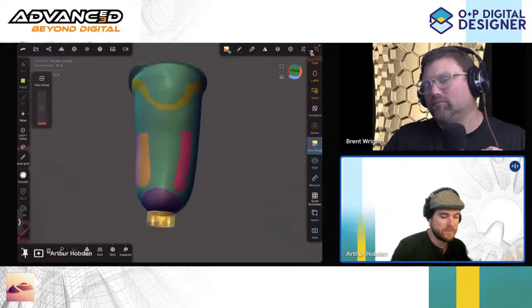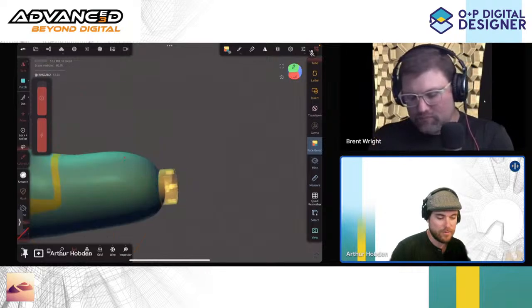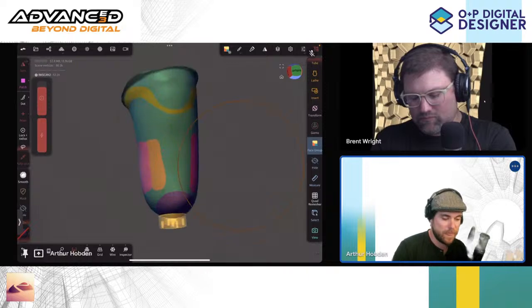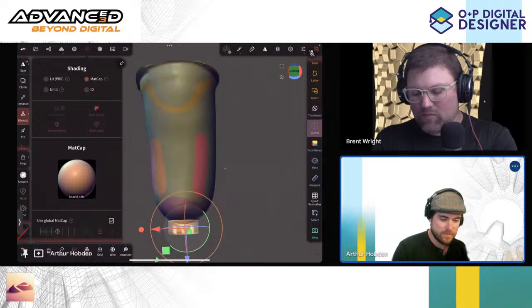Cool. All right, so we've got our zones now. Face group tool has an awesome relax tool. This is one thing that ZBrush doesn't have, or if it does, it's buried in a menu set that I can't find. But you can just scrub out all of your groups to make them super smooth, which is something that even Mesh Mixer has. So now that we have that, we can modify using that gizmo tool, turning on face groups so I can see them.